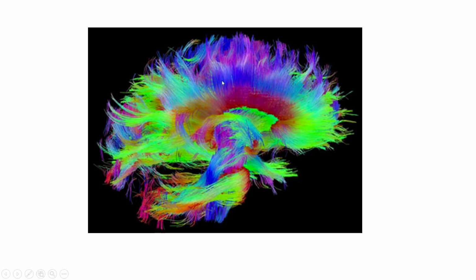connections, you can see superior to inferior and how the white matter tracts run, as well as the anterior to posterior, and there's some anterior to posterior here as well. So it's just interesting to look at it and to see how the white matter is just sort of diffuse within our brains, and they're really neat images. This uses a diffusion technique in MRI.